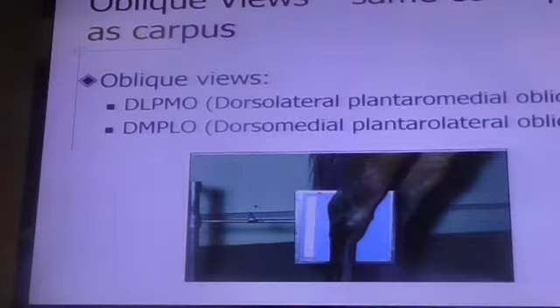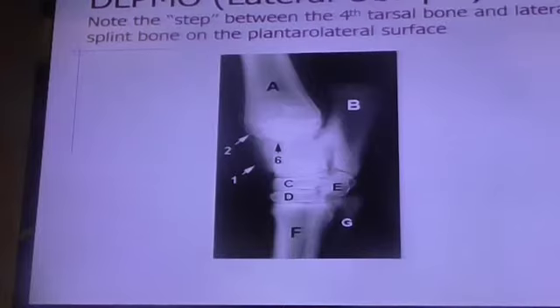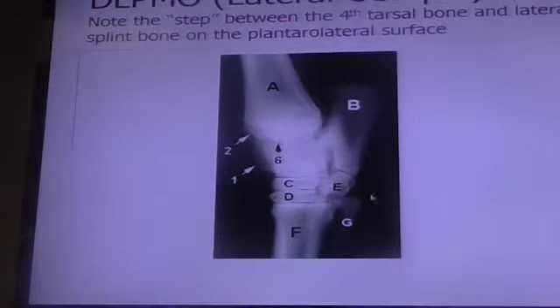Okay, so the oblique views are the same concept. You're now just using the term plantar instead of palmar. Okay? Look at your nice L, see the lateral? And you don't see that articulation well, but you can see the ridges of the tibia if you're looking for fractures or OCD lesions. So this is a lateral oblique.